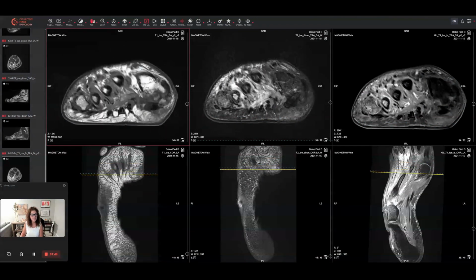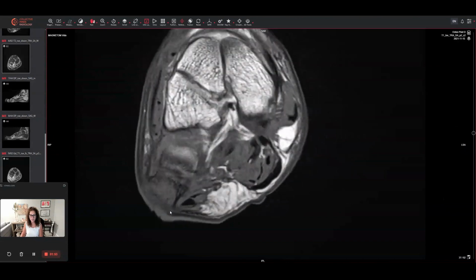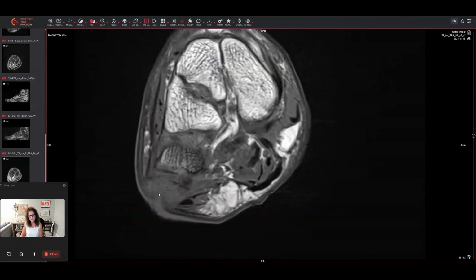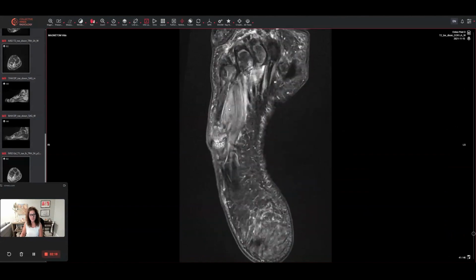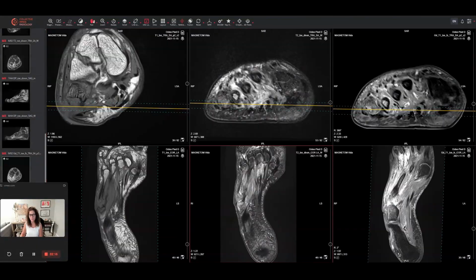And of course, we can see that so much better when we do a transaxial image, a short axis image through that region of the skin, and really appreciate the whiskering. Well, you can see that there's some idea that there's been this infiltration. This is what we saw of that base of the fifth metatarsal. That's that location right there. And when we look at that under T2 weighted images, you can really appreciate the degree of marrow edema, the location and the proximity to the soft tissue ulcer.